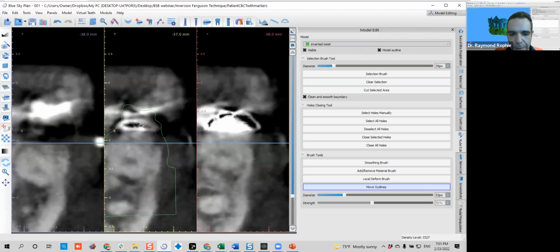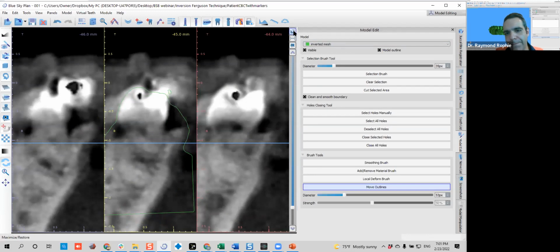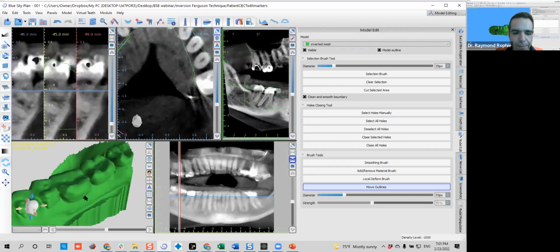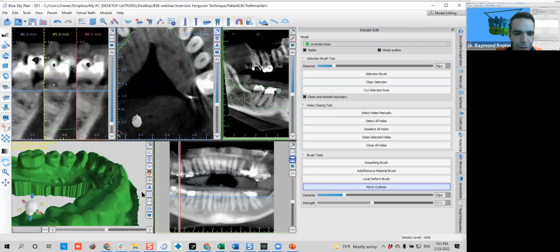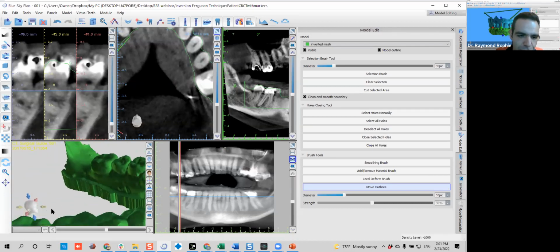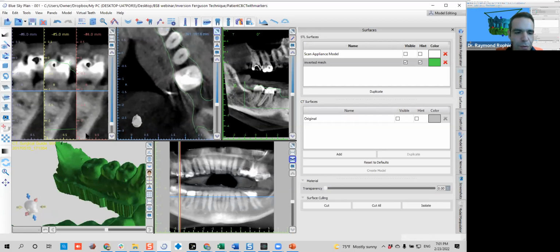So you can align this better, and now it's perfect. Okay, so this tool, Michael showed it to me and I thought that it was brilliant. I use it so much every day. That's why I wanted to take the time to show it to you.